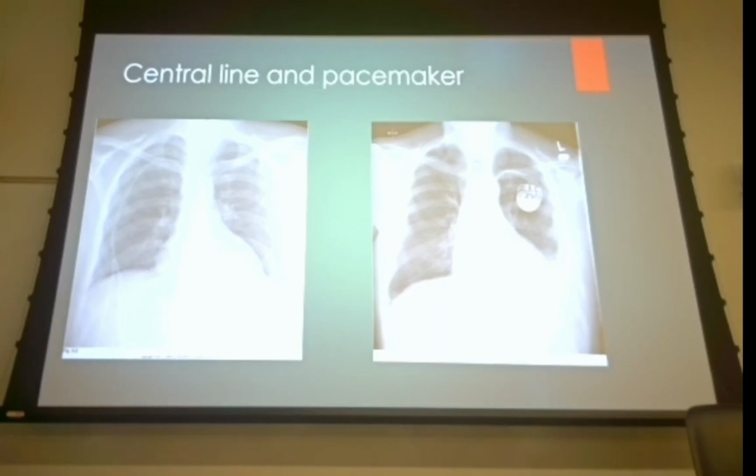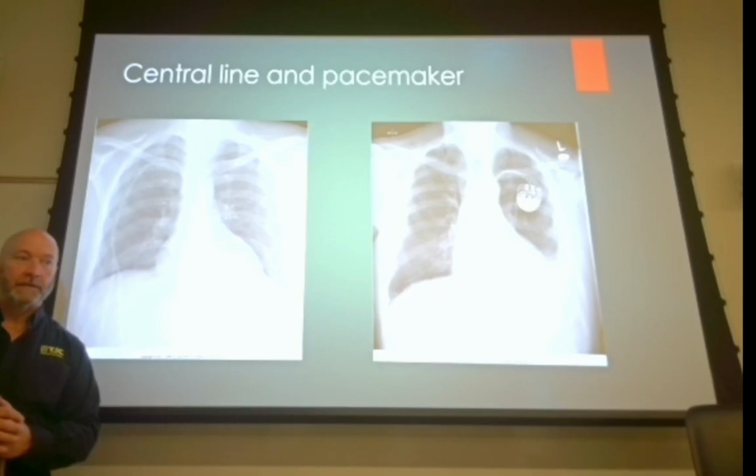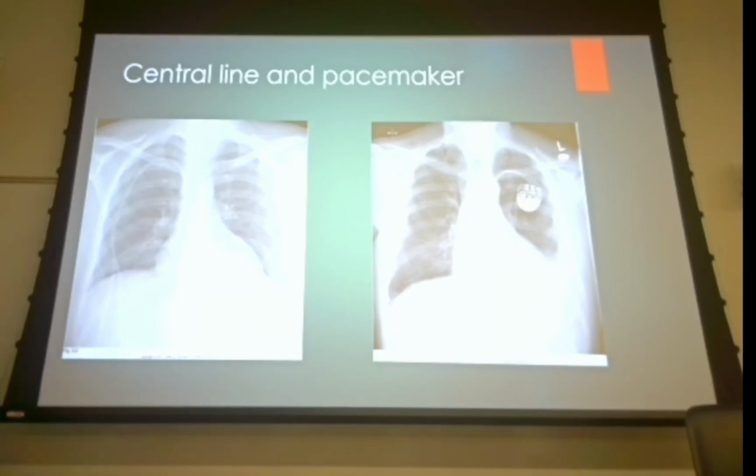What's more important to see? Well, the first thing you should consider is go ask the nurse, are we doing this for central line? Nurse says yes. Ask second question, blood all over the table, blood all over the sheets, was it a hard stick? It's probably self-evident, it was a hard stick. Ask them, was it a hard stick? And if they say yes, third question, are we concerned about a pneumothorax? Because in light of what I just said, what's more important to visualize, the collapsed lung or the position of that catheter?